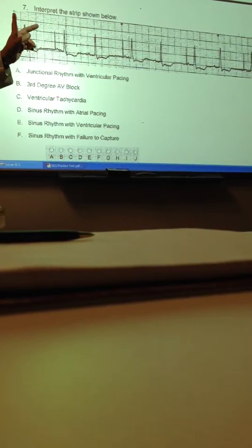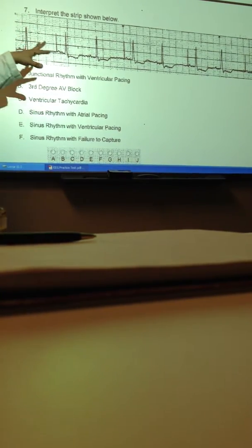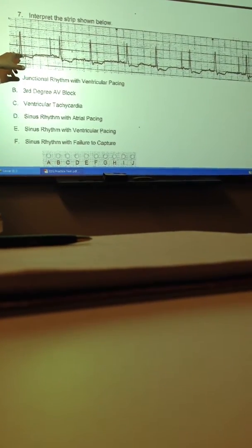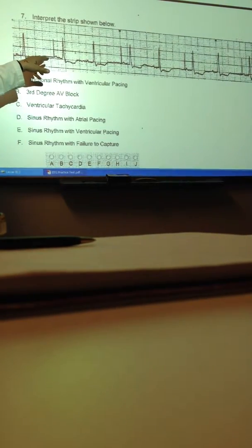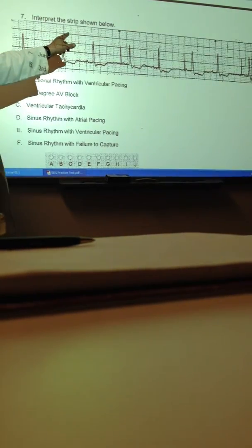This is actually a demand pacemaker. Remember we said on demand? So it fires when needed. So here's a pacer spike because here's one, the regular beat. And it says, you know what? You're taking too long. I'm going to fire. Here's the beat.